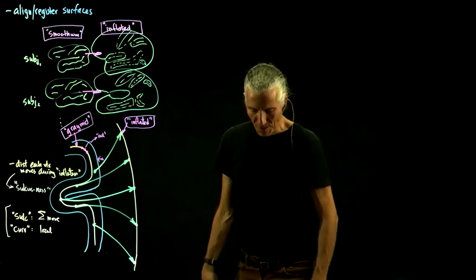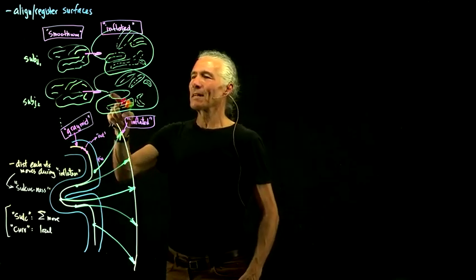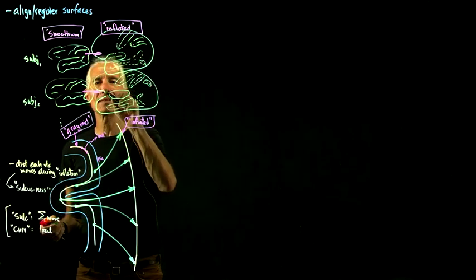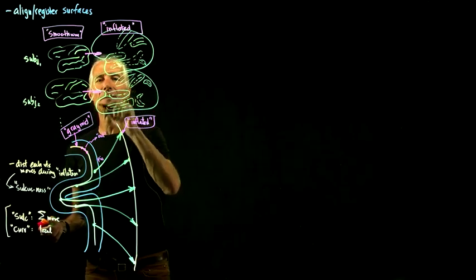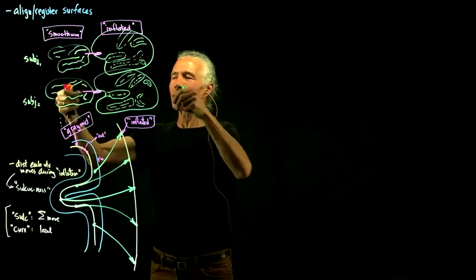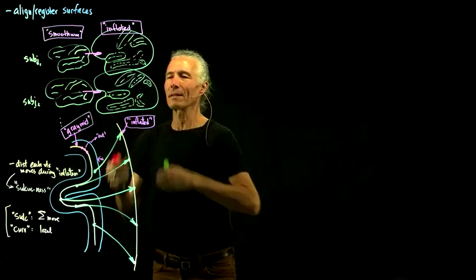When I first did this, I asked, what does the brain look like after it's been inflated? It looks more or less like an ellipsoid. If you look at an inflated brain, it's not quite, but it's really elongated that way, and pretty elongated that way, and not very elongated left to right.